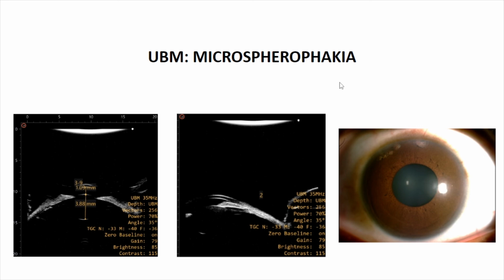In the second image, you saw some changes in the corneal endothelium. It is possible that it is touching the corneal endothelium, so you've got to watch that eye. It is again a dynamic process. You need to check that part. You should ask the technician to say what is there, whether it is touching the corneal endothelium or not. They should be able to dynamically check that.